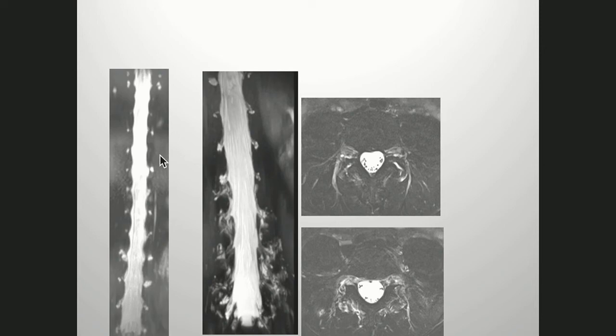And the patient had a successful blood patch. In this particular case, I don't have follow-up, but in other cases I've seen that when you do repeat imaging and the original leak site is fixed, this kind of fluid seepage is resolved as well. So again, it's not necessarily the site of the leak, but indicates that the overall leak condition persists in the sac.